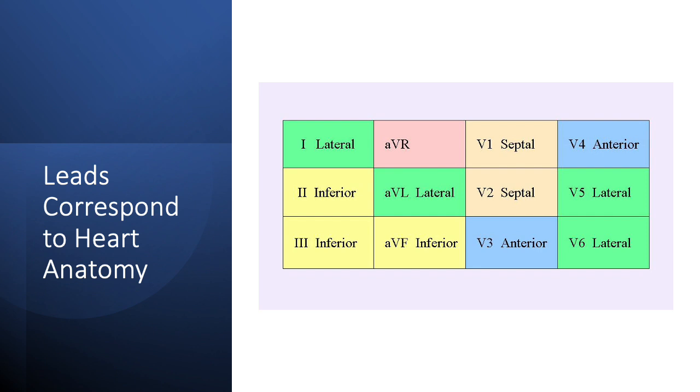You'll notice that AVR is kind of off by itself and not really labeled. AVR, for the most part, is the forgotten lead or considered a throwaway lead. For our purposes, that's probably true. There is some information that can be gleaned from an AVR. It's typically cardiologists who are interested in what they can see in AVR.